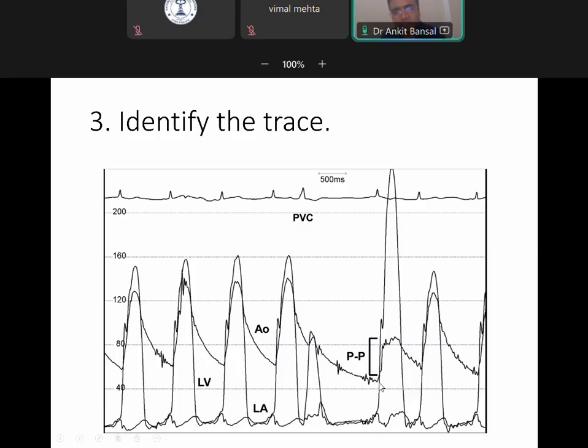The diastolic pressure is going down because of the natural phenomenon. Because of this excessive increase in the LV pressure, the aortic systolic pressure is going down. There is increased stenosis that is causing the narrow pulse pressure. So till here, everything was the same. The ectopic beat came, poor LV ejection, leading to a decrease in SVR. Decrease in SVR is causing the low diastolic pressure.